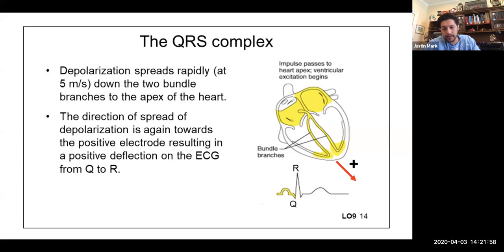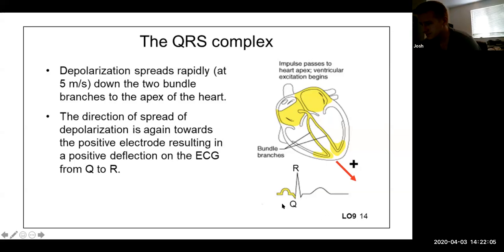That's why I think they didn't take any time to highlight it. It could be 1, it could be 2. For all I know, it could be 3. It doesn't really make a difference here. This is but what it should be ideally. You know what I'm saying?